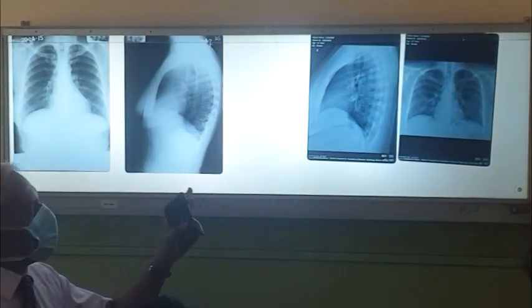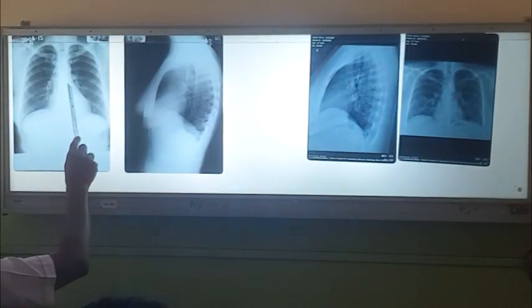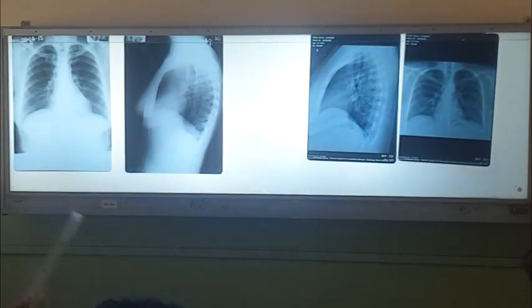So these are the points that a lot of doctors won't look at. So make it a habit to look at them, right? And then this is the left ventricle. Next to that there is air in the lingular lobe. So if the lingular lobe is involved, this line will disappear. So if there is an opacity here and an intact left ventricular margin, that means the lingular lobe is intact, and there is opacity behind the heart, that is in the lower lobe, right? So this is how you assess.